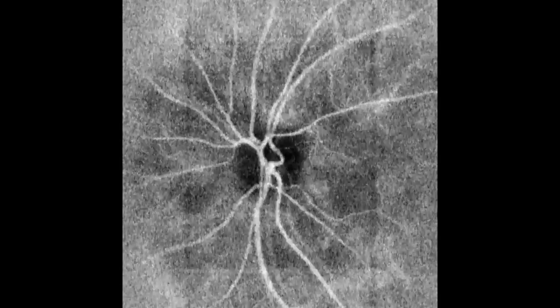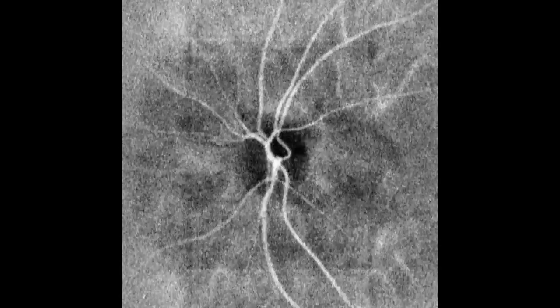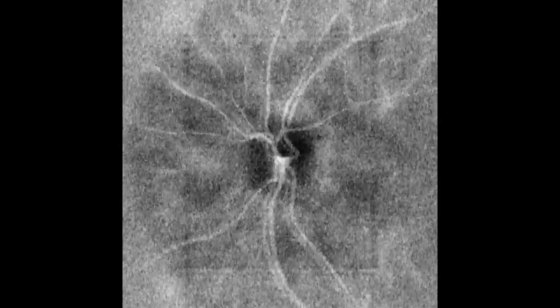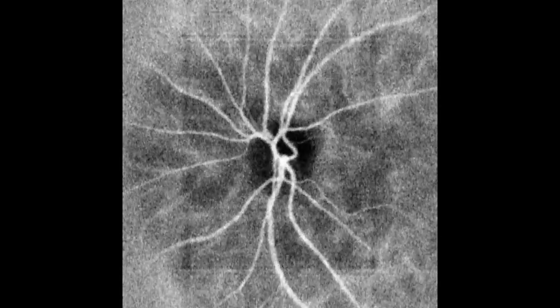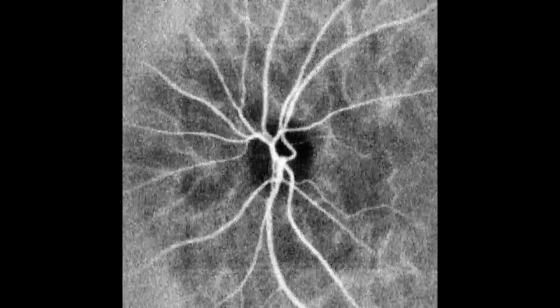The signal washout due to local dispersion outside the detection bandwidth of the streaming camera, that's a consequence of higher local dynamics, can now be revealed by reversing the contrast of the previous processed image.